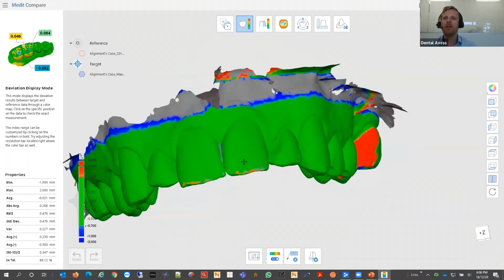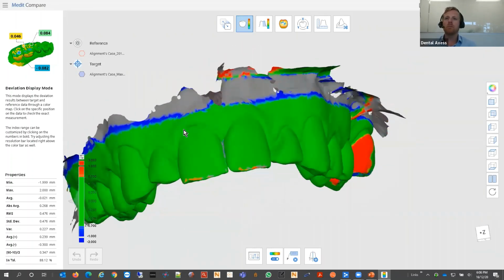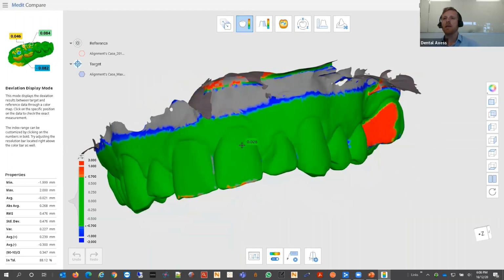And this is so easy. Years ago, I've used some industrial engineering software to do the exact same thing, and it takes about 20 clicks in about 3 minutes just to get these aligned. But you can see now, this is just click, click, done. Anyone can do it. It's wonderful.